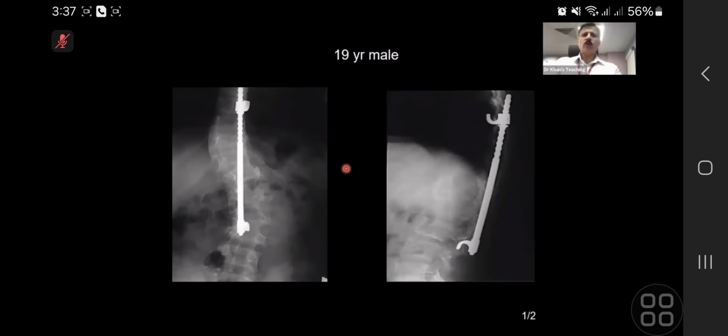achondroplasia. No, in your case here, you have got scoliosis. You have got long segment instrumentation. So this patient had scoliosis and long segment instrumentation. Then you have significant posterior scalloping at multiple levels. And by the way, you can see the pedicles. Pedicles are not decreasing in interpedicular distance. So, what is the conclusion then?